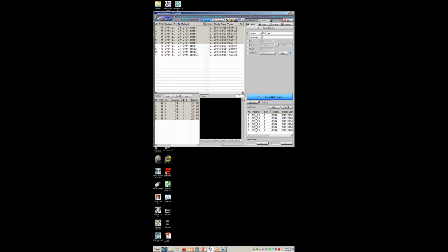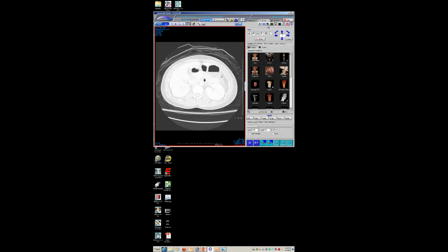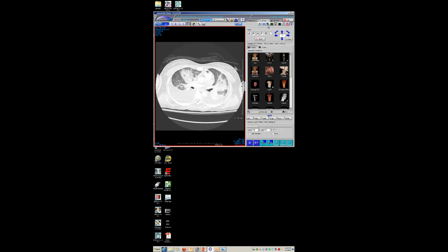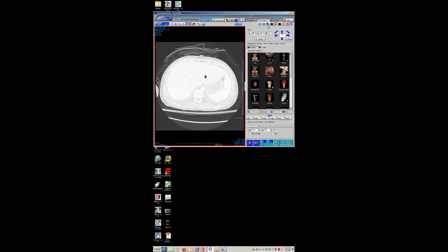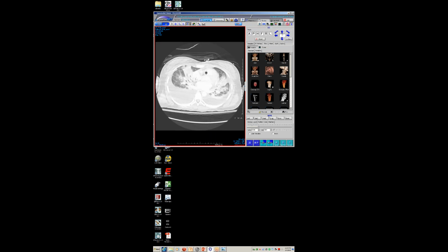Here is the CT from the case, where we see what we would expect with acute eosinophilic pneumonia, which basically looks like a combination of fluid overload and/or DAD or pulmonary hemorrhage. Pathologically, we know that it does represent a combination of capillary leak and alveolar leak, and is basically ARDS/DAD with eosinophils.